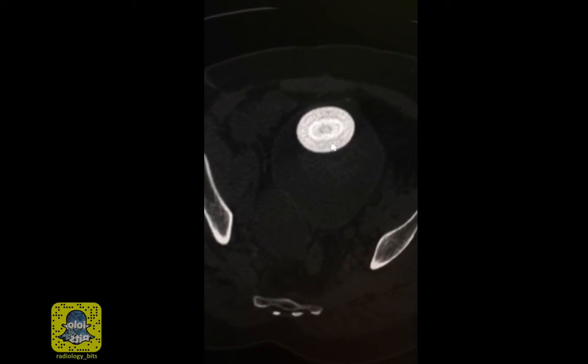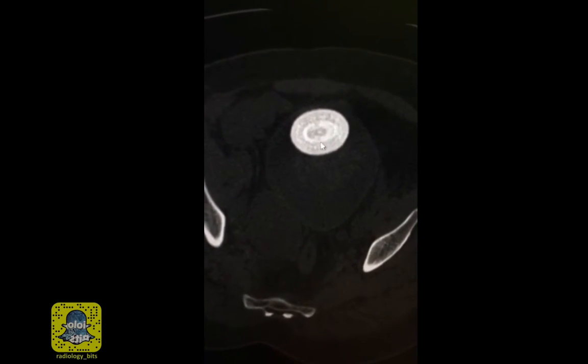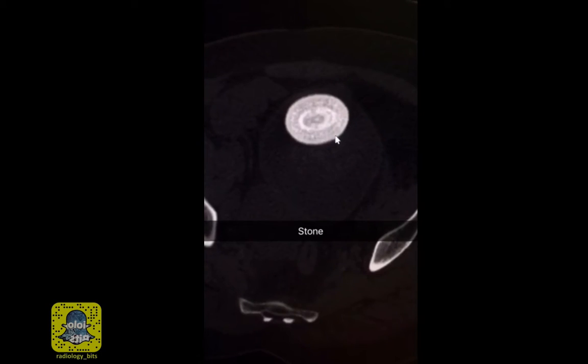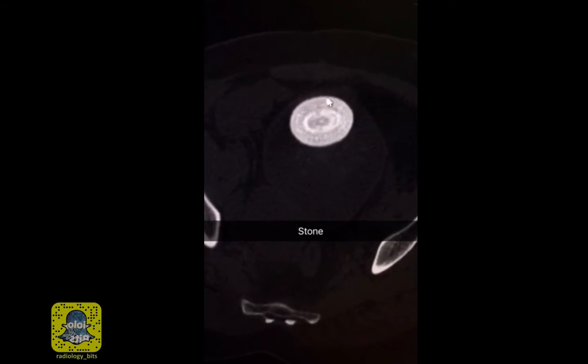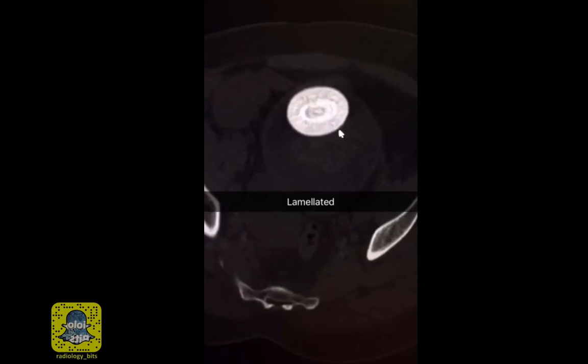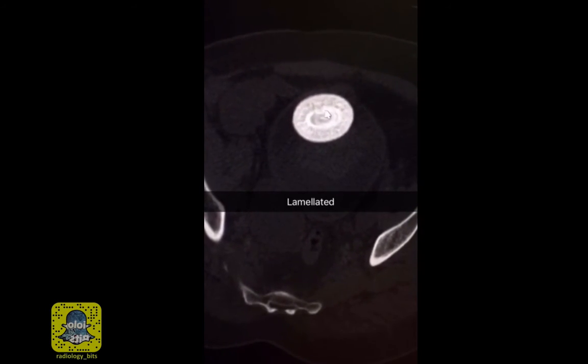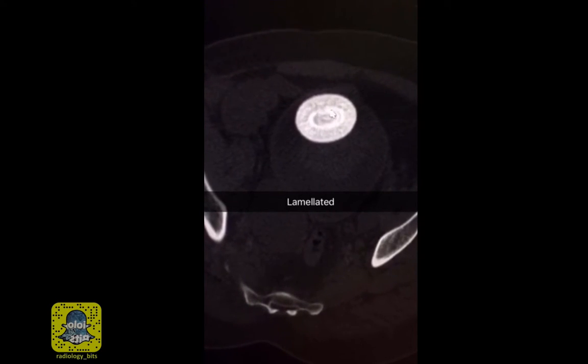So it's definitely calcific, it's very well defined, and it has this peculiar appearance of different internal layers. Even though the size is large, this is a classic appearance of urinary bladder stones. The reason this appears like this, a lamellated appearance, is because these layers deposit over time.